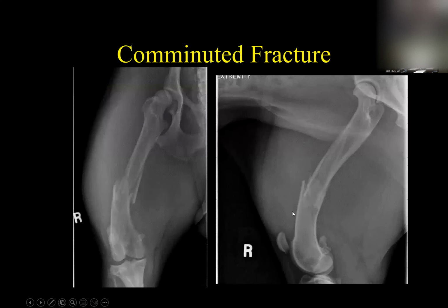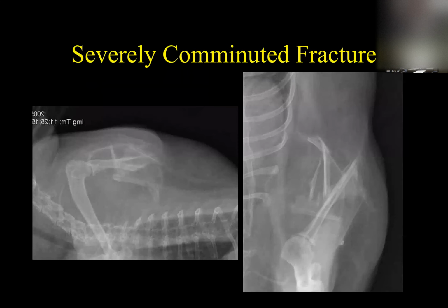Okay. There's another comminuted fracture. This one has one piece of the bone up in here. There's another piece of the bone here. It looks like a mineralized fragment sitting right in here. They're overlapping here. There's another fracture extending through here. So another fracture extending through there. So he's got multiple fractures. It's a comminuted fracture, multiple pieces.